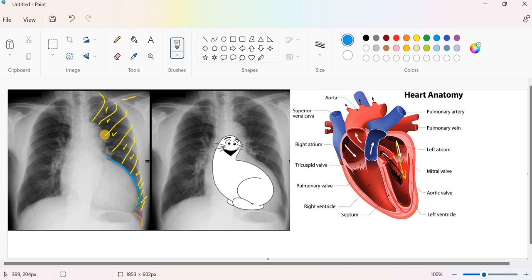And this is with the dilated aorta sometimes, or prominent aortic knuckle sometimes. It gives us this sign that you are seeing, the Schmoo sign. Schmoo sign, this is a cartoonic character. Okay, so this is the left ventricular enlargement and the hemodynamics behind it, why it might happen and how it might happen.